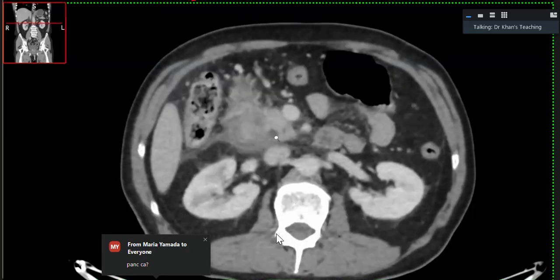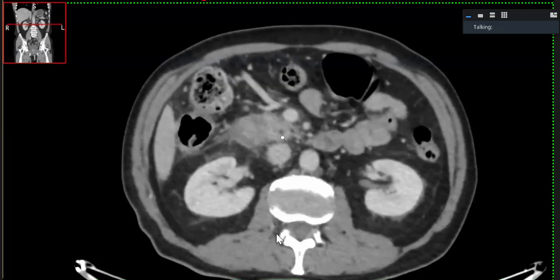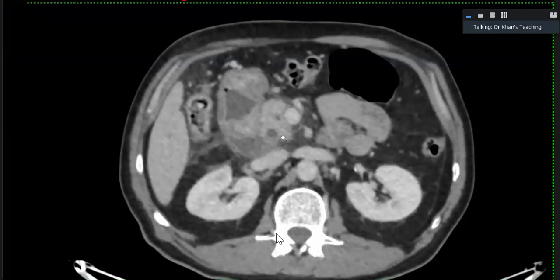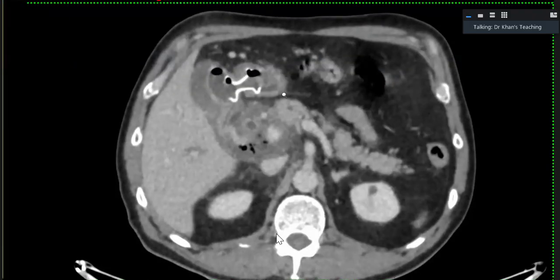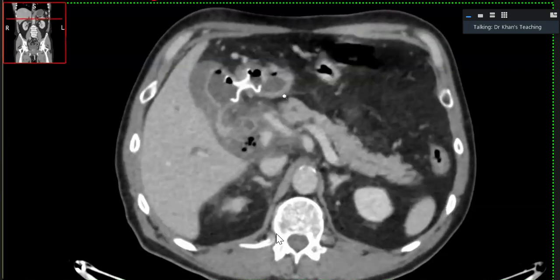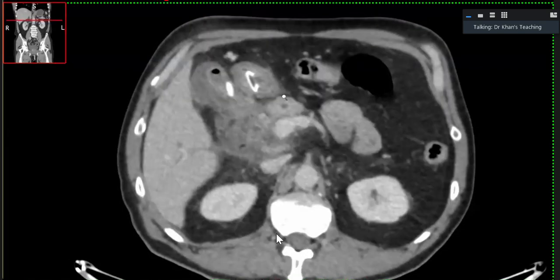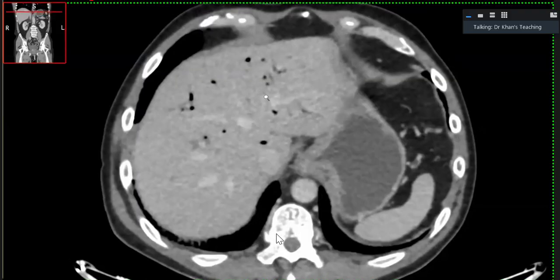So the CBD is obstructed because of the duodenal. So this was a duodenal carcinoma. What they have done is they have done the procedure for temporary. I think these things can go on for about 2, 3 months. The life, I mean to say. So they have caused a bit of complication, not great, but a bit of complication.